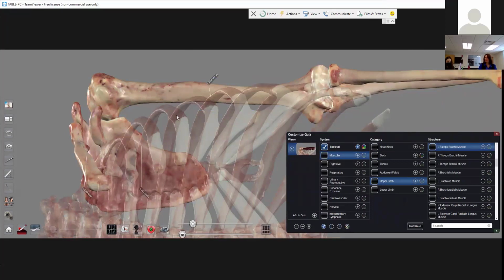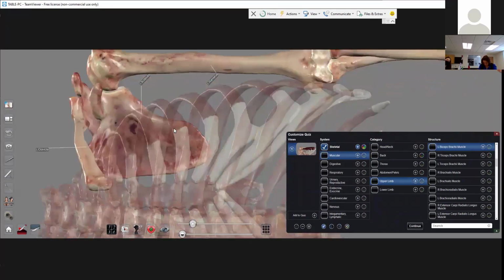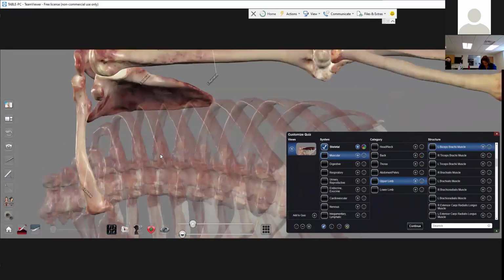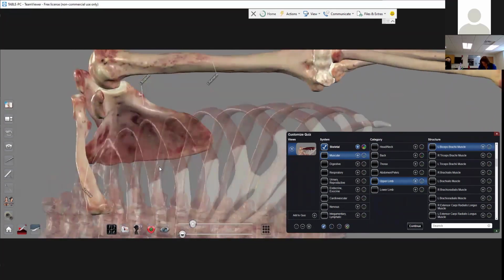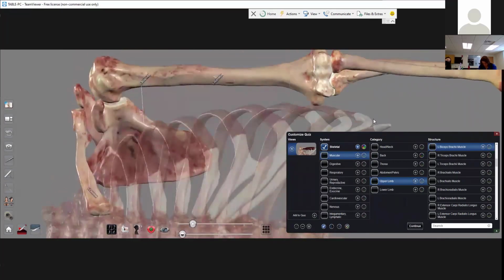And then once you've added whatever questions you want and you've gotten your quiz to look like what you want it to look like, which I am over rotating because I still am having like a 3-second lag on my version of your table. Come back. That looks good. You can hit add to quiz. So that's an important step that people forget sometimes. You can't just hit the plus signs next to all your quiz questions and hit continue. You also want to hit add to quiz and save it as preset 1.